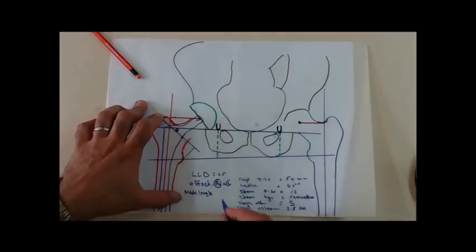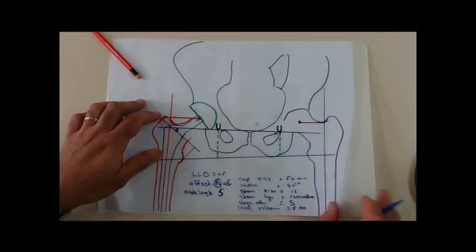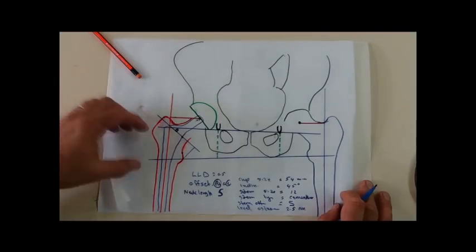For example, in this case, medium is not acceptable, I will solve it with the small. I should put all these figures in front of my eyes in the operative theater, because all these figures should be memorized during operation, and during operation I will go to revise these figures per-operatively. By doing this, we have finished the templating for the total hip replacement.